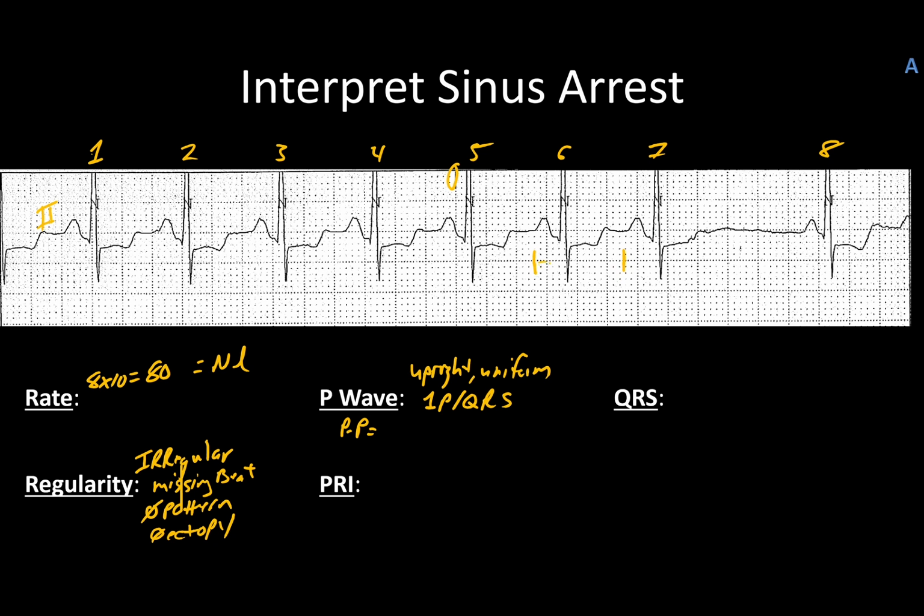And that comes out to exactly 15. And then if we measure this space across here, we wind up getting 29. And in fact, if I measure back this direction as well, this one comes out to 15 also.